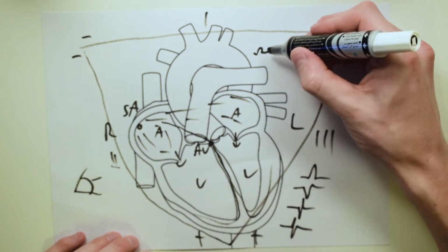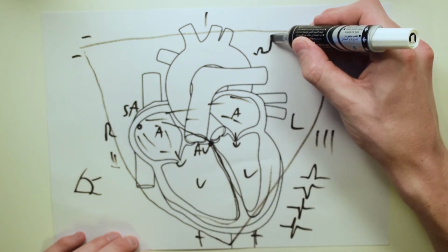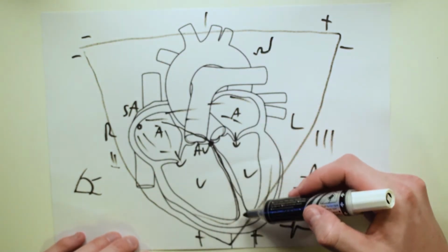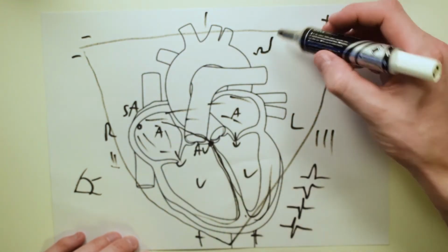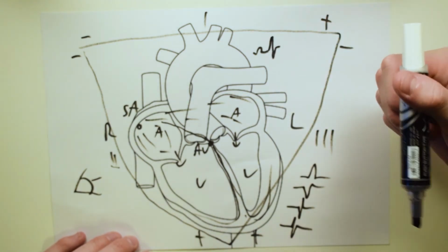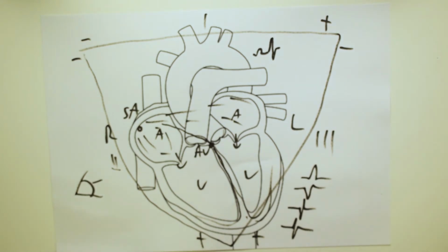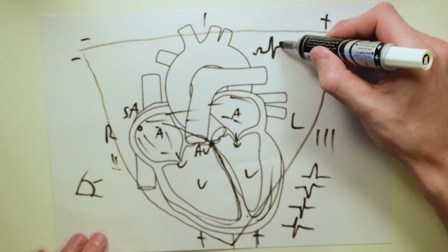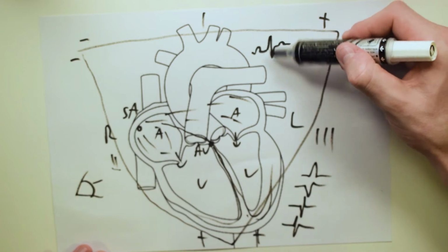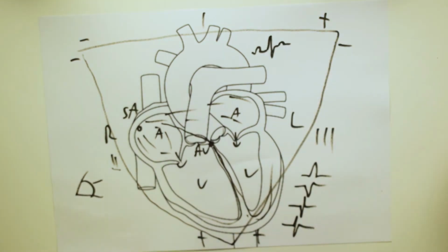So there's this massive up, all right? So that's that because it's going from negative to positive. And then we see this curving around the heart, which then gives us an S wave. So the heart then repolarizes and it gets ready for another contraction. And what that does is that then that looks like another wave, but much smaller. And we have the T wave. So we have your P wave, QRS, and your T. In the next ECG, we will be talking about that more. So let's move on to our first ECG.